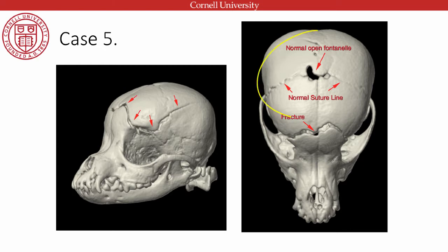She's got an open fontanelle, which is normal. So looking at these skulls, and she has these suture lines, which are visible too, and that's normal. So detecting the difference between a suture line and a fracture is really important. And the big thing is to look where are normal suture lines running? They're usually bilateral, they're usually fairly symmetric, and they're usually in predictable areas between the bone plates. So this is frontal bone versus parietal bone. So that's perfect, that all fits. This is a midline suture line here. So that fits that these are suture lines.